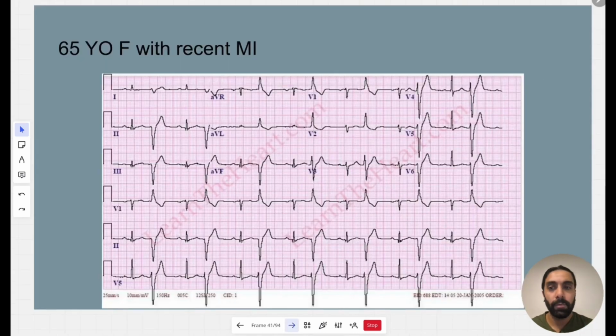So yeah. Okay, you know what to do. 65-year-old female, recent MI. Go ahead and pause your video, review this one.